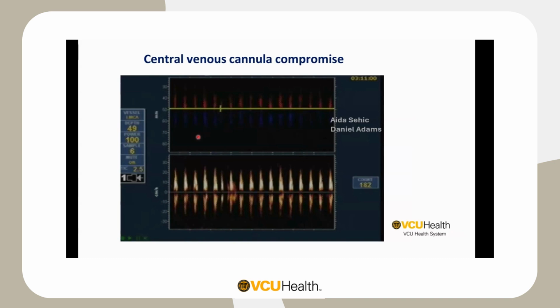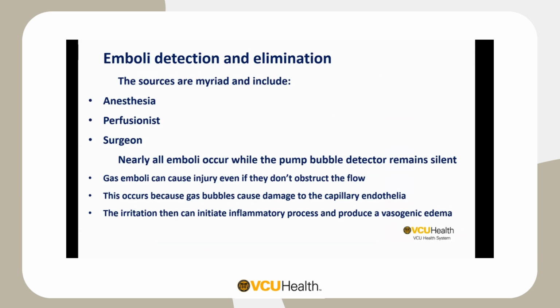A 2-year-old female patient came in for VSD repair. Venous cannula malposition, again, loss of diastolic flow, immediately recognized. TCD is very good in emboli detection and elimination.